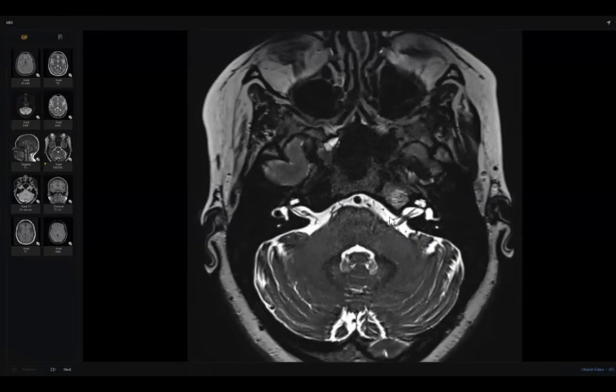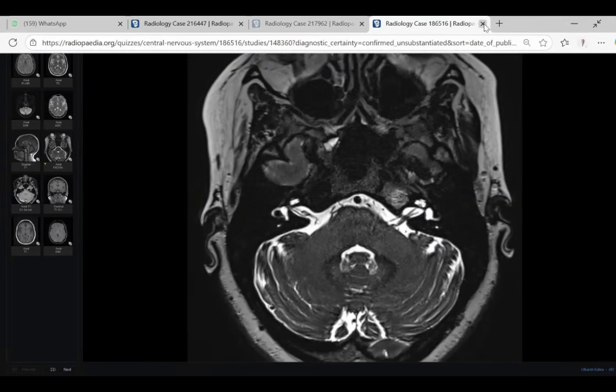This is the cisternal or intracranial part, then the canalicular part, then the labyrinthine segment, then another two parts. I'm talking about this intracranial part. Normally enhanced or not?